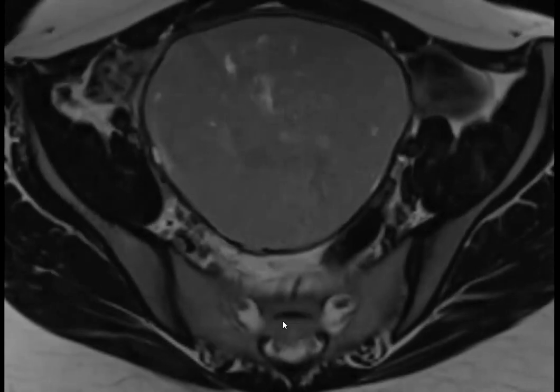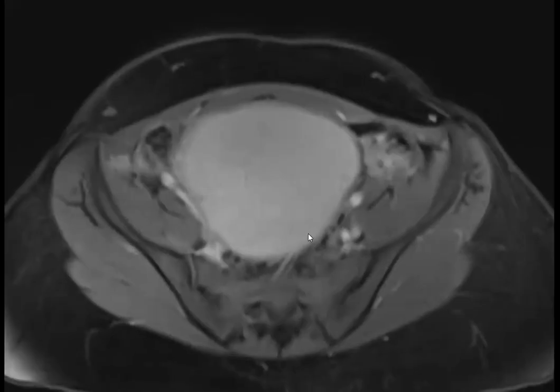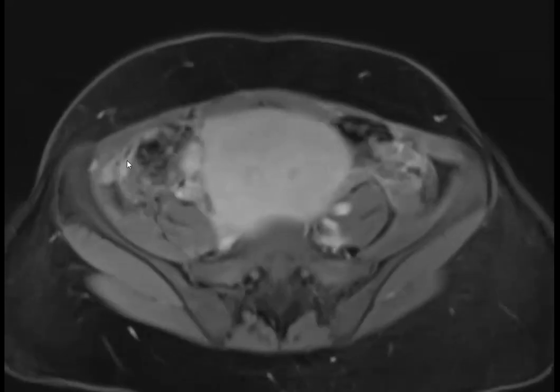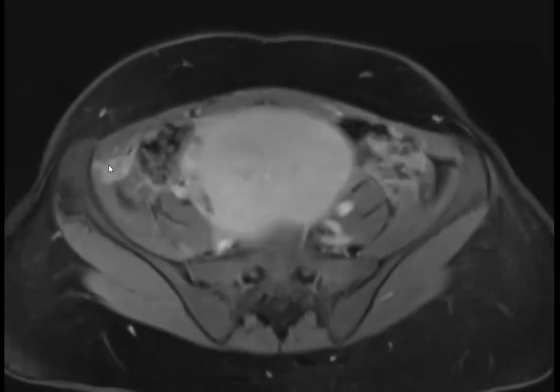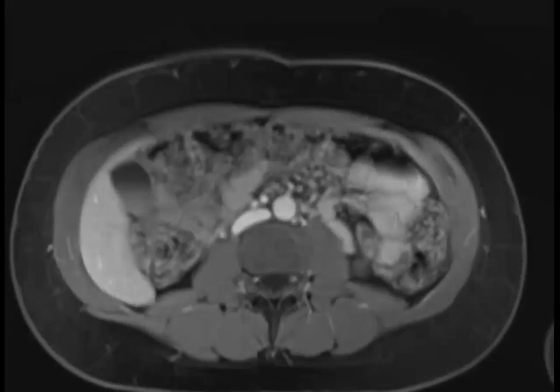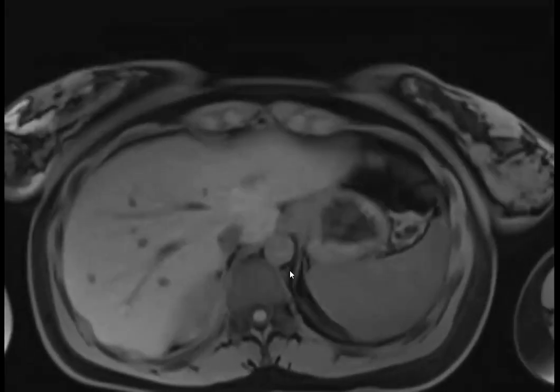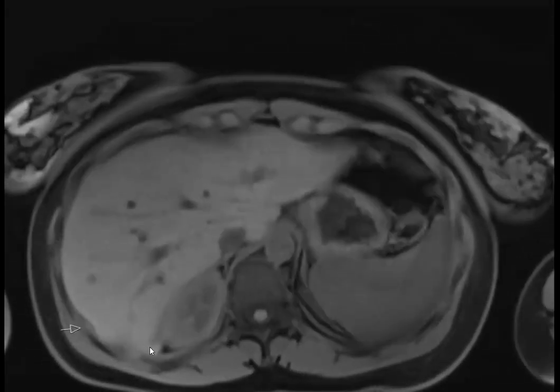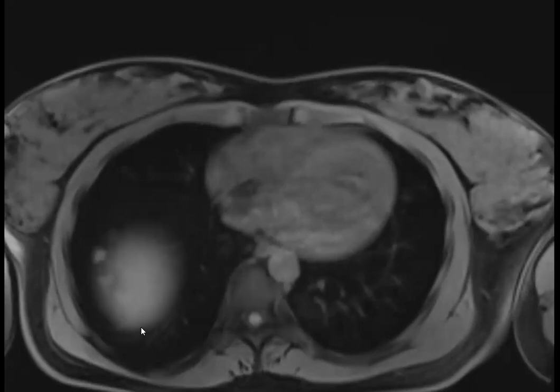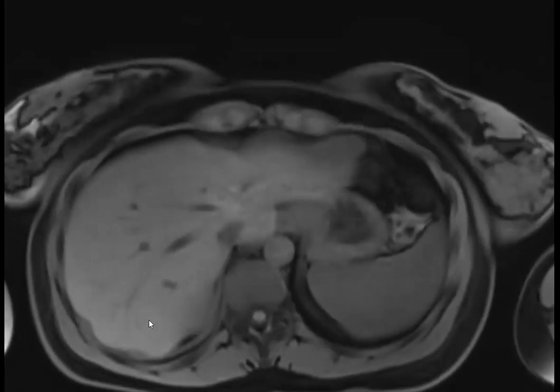And then the case gets even cooler because in the pelvis, there was also some weird enhancing tissue here, in the right lower quadrant on the cecum, but also extending into the abdominal wall. And it gets even cooler because as we get to the liver dome, we can actually see that there are lesions here. I'll show you in a minute that they're enhancing, but at the high liver dome, there are all these T1 bright lesions. So what do you think these T1 bright lesions are, or even these lesions enhancing along the liver surface?